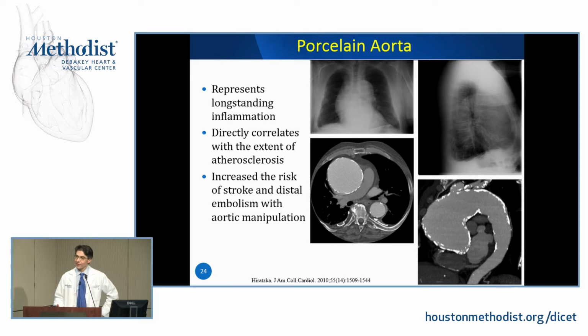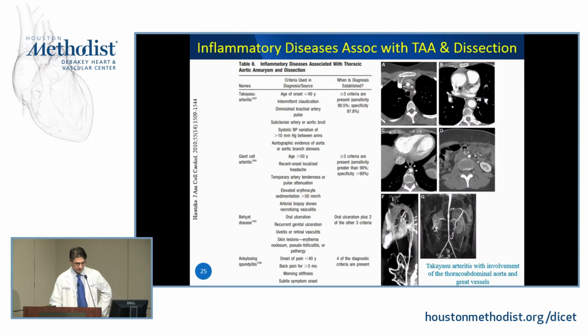What is a porcelain aorta? This is it, where you have diffuse calcifications. It generally indicates long-standing atherosclerosis and inflammation, and it's a major problem for our surgeons, with the risk of any type of manipulation leading to either dissection or strokes.